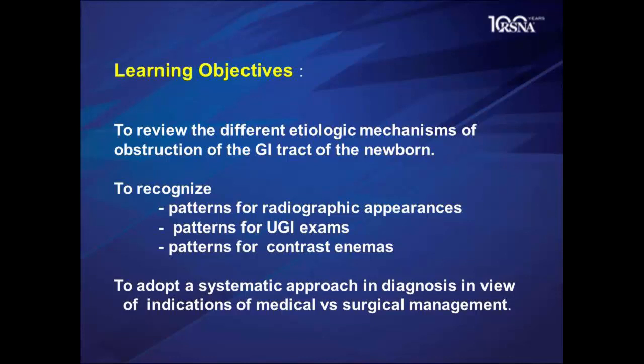First, by recognizing the pattern of radiographic appearances, then also analyzing the different contrast study examinations, as well as the contrast enema studies that will be performed to solve the clinical problems.